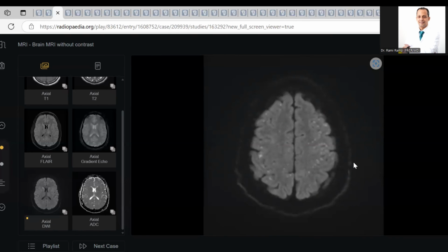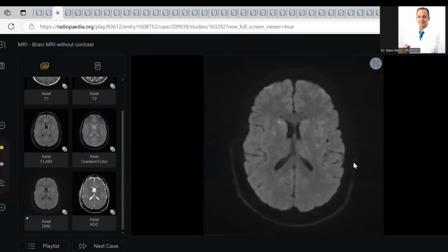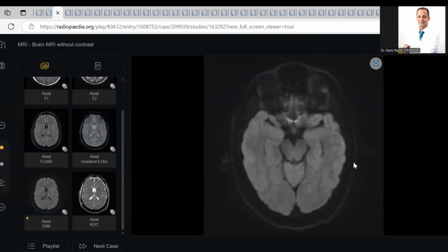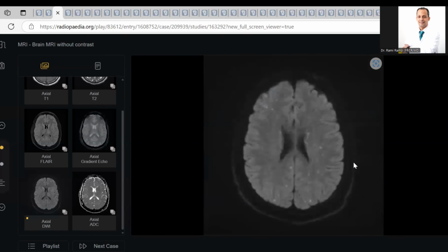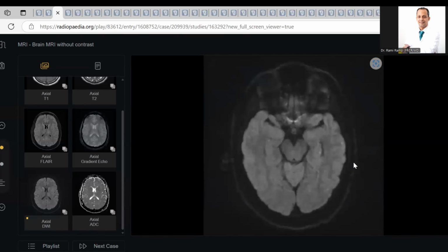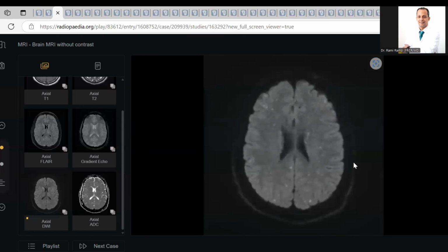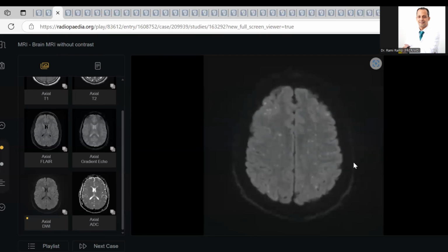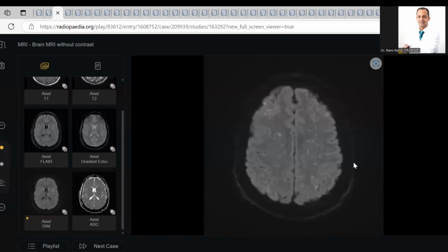This is a trauma patient, my colleagues. So try to make your differential diagnosis in a logical way. When you told me this is a diffuse axonal injury, I agree with you, but don't speak about something chronic or congenital or demyelinating. A patient with a major pelvic fracture or any fracture, the fat makes a showering. This fat embolism makes this pattern, and this is very characteristic.